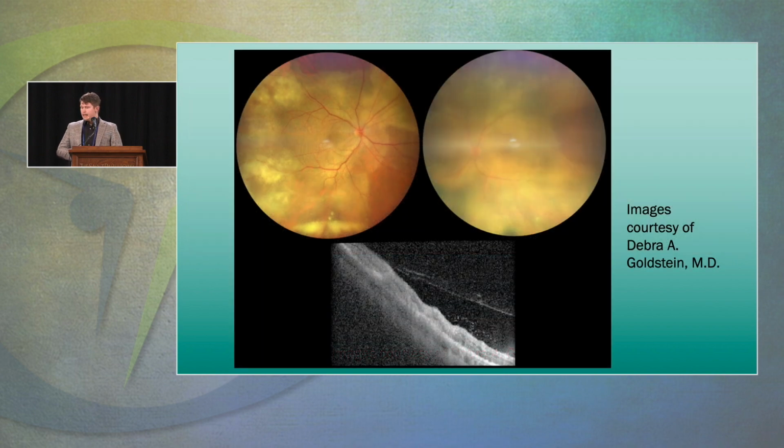And then this is a case of the more classic retinitis. Unfortunately, this was a case that came to my mentor after receiving oral prednisone without getting penicillin first. So we talked about how this can have devastating consequences. This is the devastating consequence. It's full thickness retinitis. You can see on the OCT, the entire retina there is sick. That's not going to recover with treatment. So if you give steroids without checking the RPR and they actually had syphilis, it will get worse.